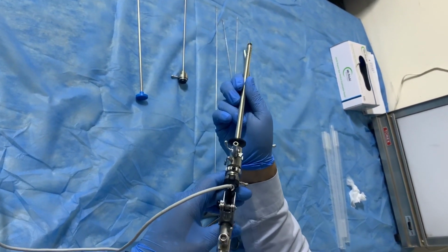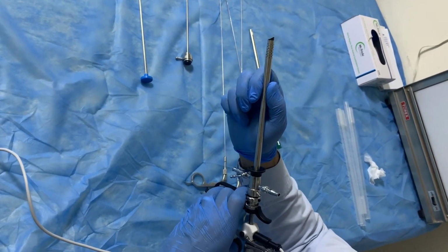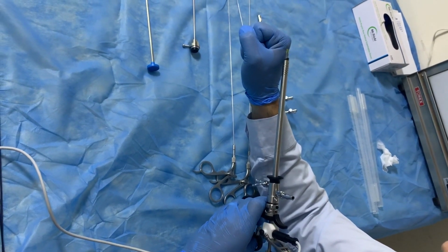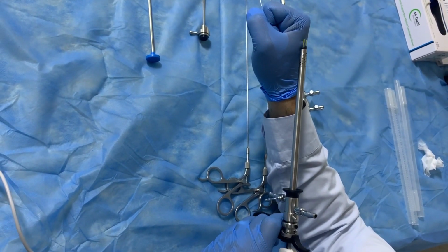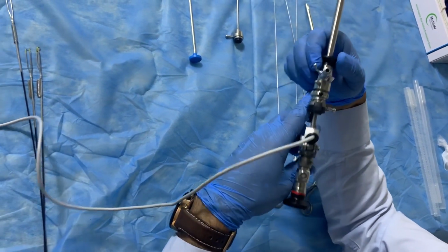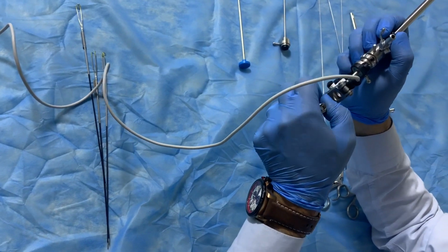Just press on this area and by monopolar system. Suppose here there is polyp or there is fibroid or septum, we can cut it. Bzzz, bzzz, bzzz. This work. So don't forget, first of all, telescope line should be parallel to each line.